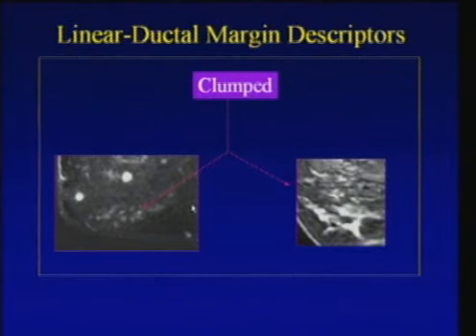Like I said, clumped is very hard to analyze, especially when it's involved in a small area. So here, this is what I mean by sort of a branching pattern. Another way I think of clumped is when I'm analyzing calcifications. These little tiny dots of enhancement, one does not really look like the other, and sometimes you can think of clumped as maybe being analogous to pleomorphic. When the enhancement is a little bit more marked, here you can see this clumped or cobblestone appearance just looks very lumpy, bumpy, certainly doesn't look like the normal fibrocystic enhancement seen more superiorly.